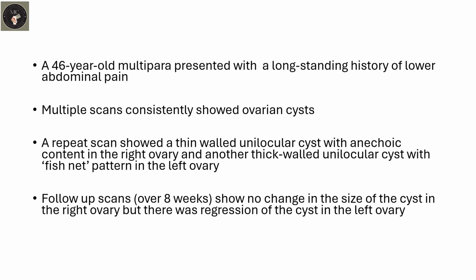Temporal changes in a corpus luteal cyst of menstruation, seen in a 46-year-old multipara who presented with a long-standing history of lower abdominal pain. She had multiple scans which consistently showed ovarian cysts.